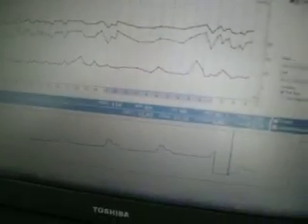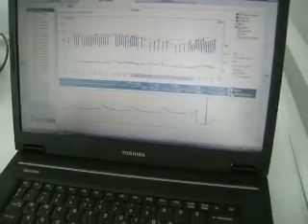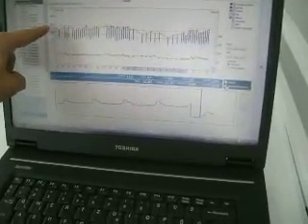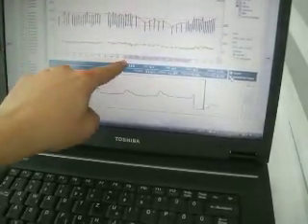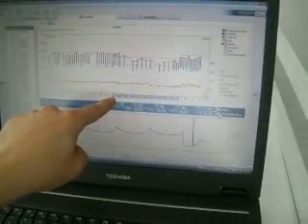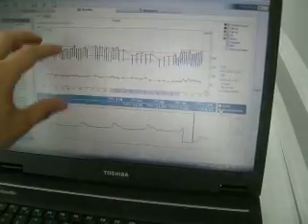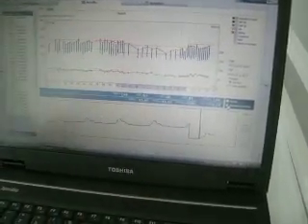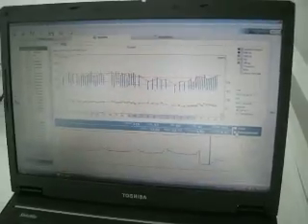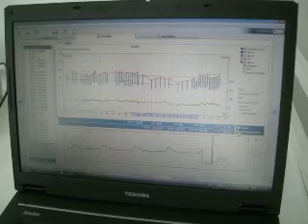Once I do this and go back to results and turn on the graph, you can see that the new threshold is 140 and the start of the sleeping phase is at 2100, which I just set previously. So that's how you can personalize the thresholds and actually the outlook of the whole measurement. There you go.